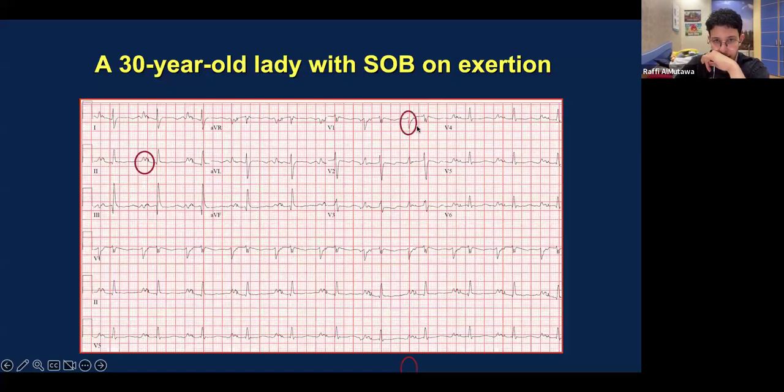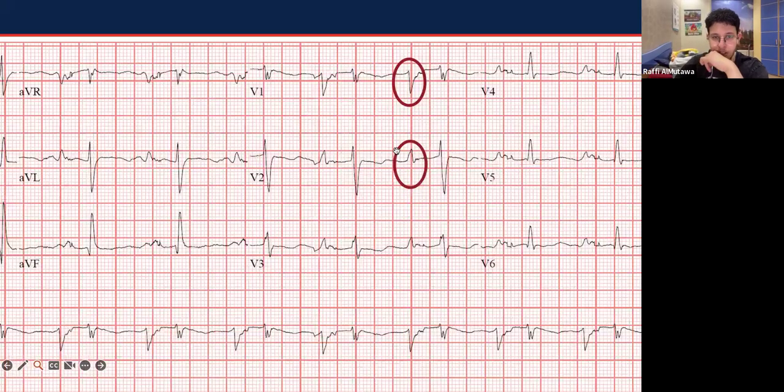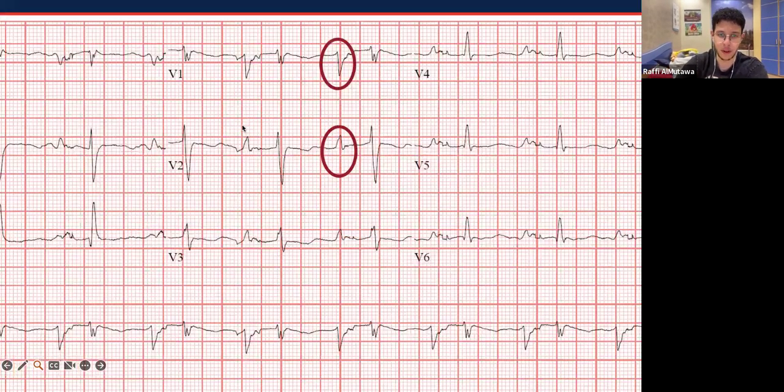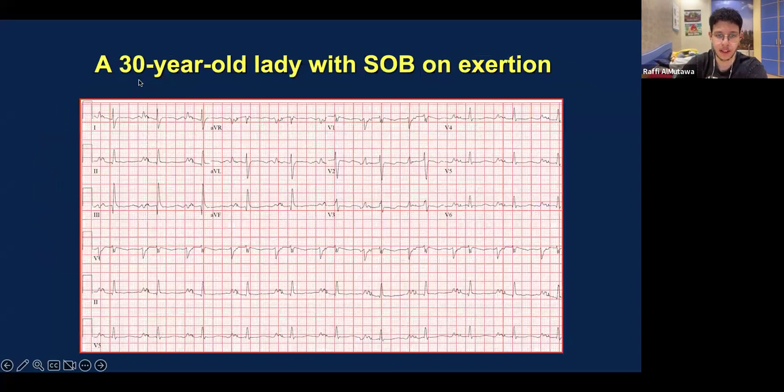if you look at this right here. So here they're trying to point out, I know it looks weird, the peak and scoop. So this is LAE and RAE. Let me explain. Let me go back to the table, because the table is the only thing that's going to make a lot of sense.